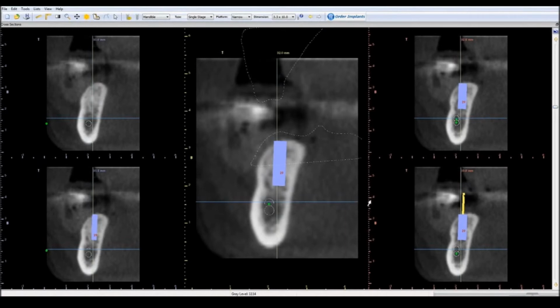What I wanted to illustrate was that this implant can be moved buccolingual. And if you picture the center line of this implant up this way, you can manipulate this implant buccolingual so that you can put the center line of the lower bicuspid directly on the lingual cusp of the upper tooth, as it should be in an ideal circumstance. And in this particular case, there's plenty of bone, so it allows me to do that.